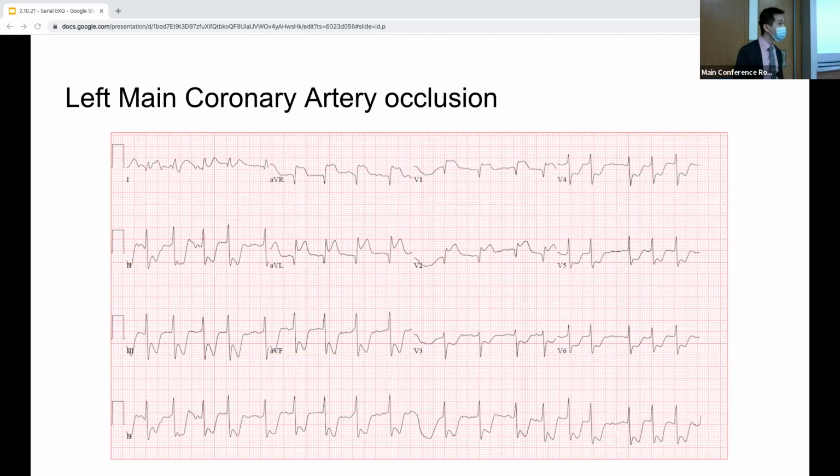Because those leads, unless you're used specially, you might not see. But if you did a lot of lateral, then you might see more than just aVL, for example, with posterior MI. And so Dr. Yu is pointing out, keep an eye on aVR and aVL. Those ones can alone be indicative of either far lateral or far medial wall infarcts.